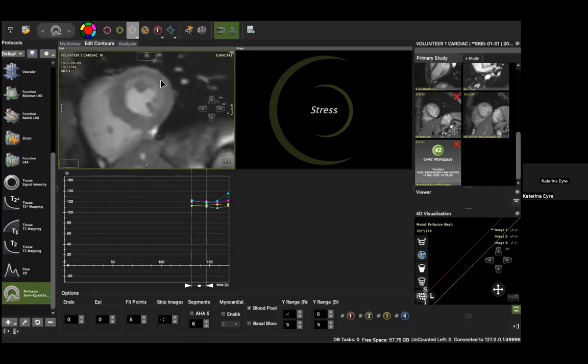I think it's about here. And at some point, the image quality may or may not get poor again. This is likely due to the patient breathing again, unable to continue holding his breath after a certain period of time. So I'm just doing the same thing.